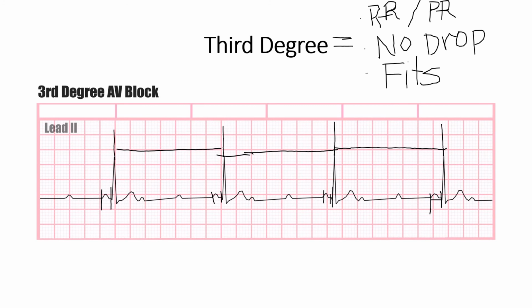Now, in some cases, third degree will have both features, and that's what I want you guys to be aware of. It will fit, and then sometimes it will not fit. So that's okay. That's why I want you guys to inspect them all. But if you get a drop, then you don't have to worry about this. But if you get a fit and a no drop beat, then you know it's third degree.